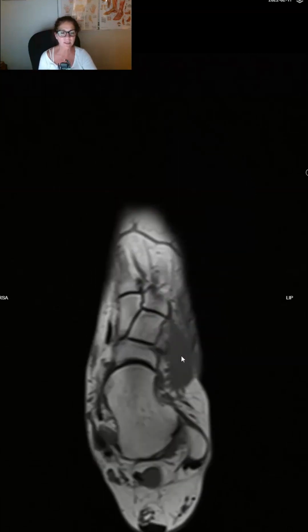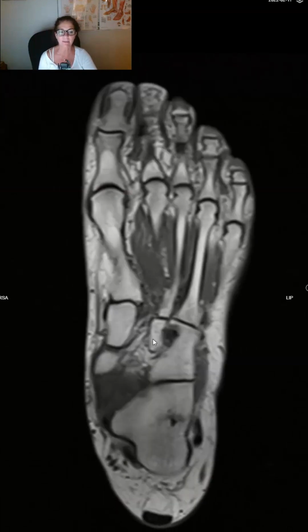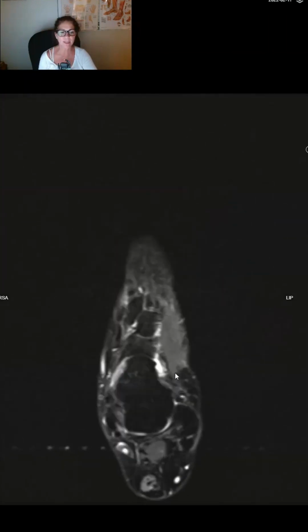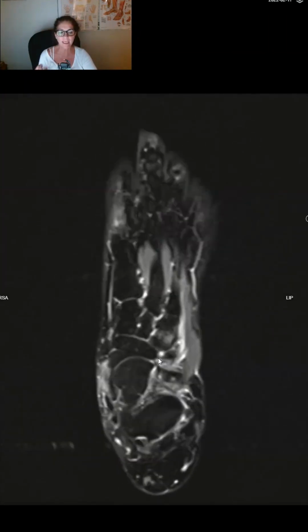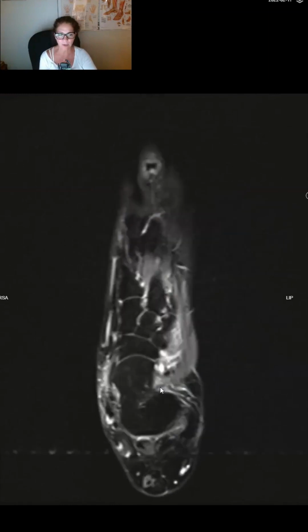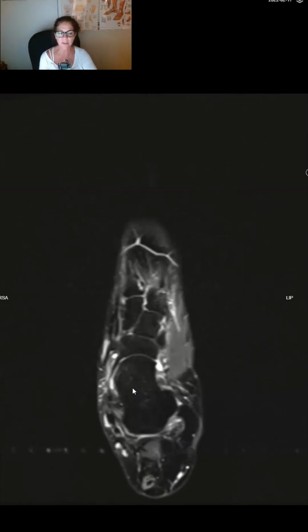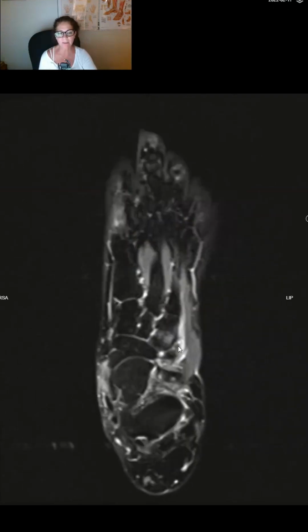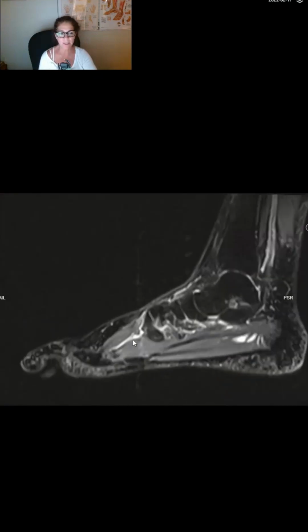And what I'm interested in understanding is what is the biomechanic that might be responsible for this? The question is, is this inflammatory arthritis? And one thing that I can't answer alone on an MRI, I would want to run parameters that check rheumatologic profiles, what we call it, to understand what is the etiology of my effusions. But I'm also going to try to understand, can there be a biomechanical reason for that particular finding?